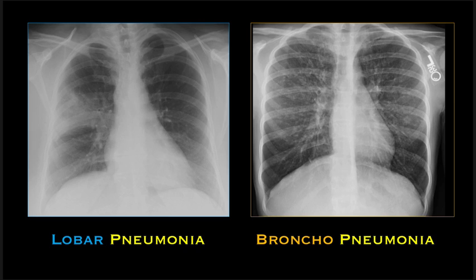And if you squint closely, you may be able to see a few air bronchograms. So those two cases had pretty obvious findings. There was definitely more going on than clear lungs, like we talked about on the first slide. Lungs are supposed to be clear, and it was pretty obvious in both cases that they weren't.